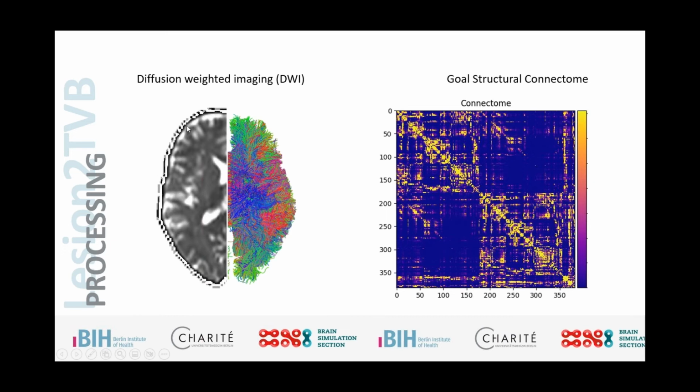So we're starting from the raw image here, performing a lot of pre-processing: normalization, bias correction, distortion correction, all these artifacts in the data where there's really no way around it. This is just because of the physics of the scanner that we have this introduced into our data, and we need to take care of this. Get to this a little bit later as well.